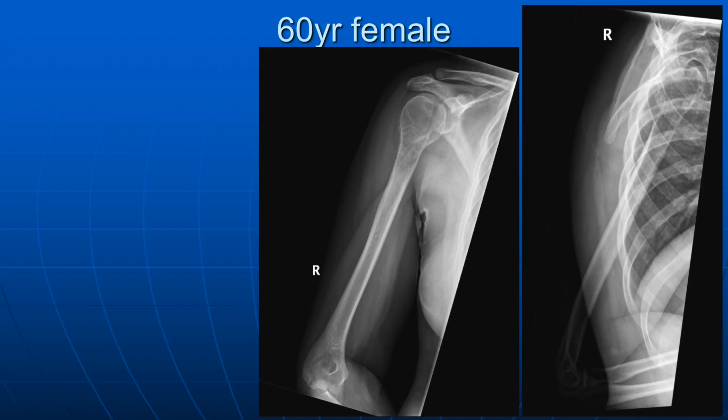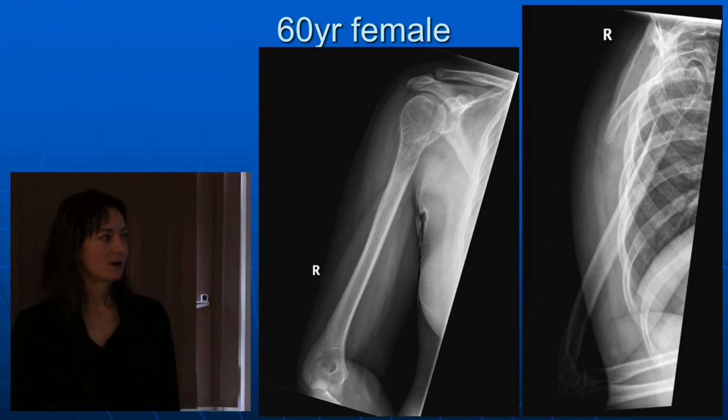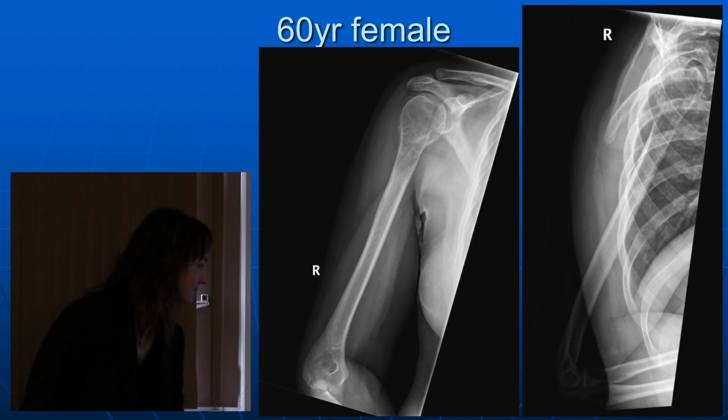Back to something a bit easier. These become easy. A 60-year-old woman with a lesion that's quite difficult to see because it's fairly subtle, but there's an abnormality of the proximal humerus, the humeral head, humeral neck. Definitely can't draw around it. The bone is moth-eaten and mottled. Maybe there's a fracture here, hard to say.